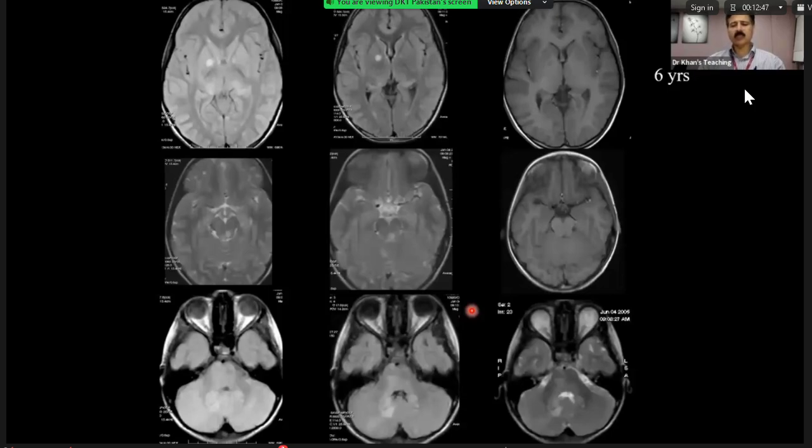The concept is that these grow in number and size till the age of 10. And after the age of 10, they start decreasing, and they might just vanish after 20 years or so. The concept is that if they start increasing after the age of 10, we raise the issue of malignant transformation. This also tells you that FASI by definition is not as simple as hamartomas. This was one of the concepts, but it's controversial because other people think that this is dysplasia, myelin vacuolization, or with potential of malignant transformation.